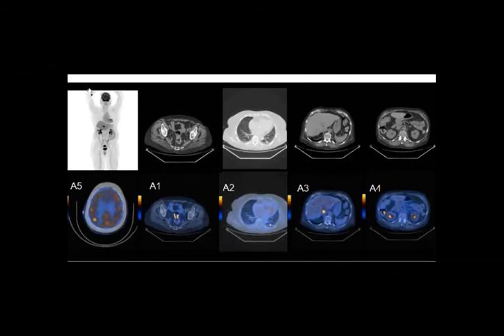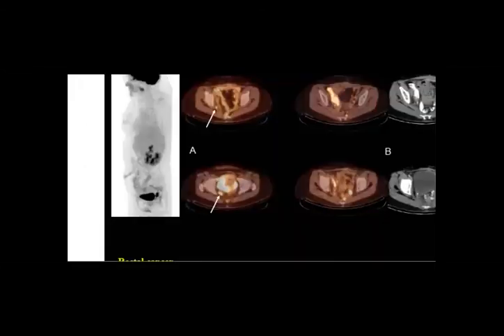There is no answer, so this means that you are sleeping. So yeah, it will be rectosigmoid cancer, Ala, thank you, and pulmonary and liver metastasis. So what do you think about this focus here? Yeah, it is the injection site. So this is the injection site, and you have liver metastasis, pulmonary metastasis, and yeah, brain metastasis. Perfect.